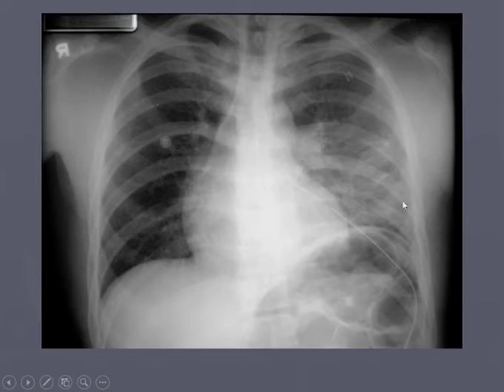All right, let me look at this one real quick. Okay, I know what this one is. Airway, maybe a little deviated. Could be because of the position of the patient, but we can see our airway here, carina's there. We have our bones, so our clavicular heads are there. Let's count our ribs: 1, 2, 3, 4, 5, 6, 7, 8, maybe 9. Diaphragm: right side looks okay.